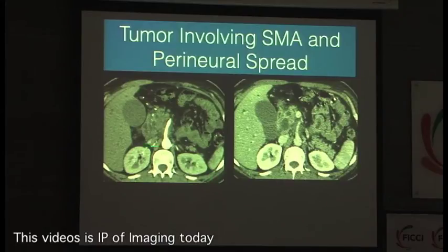So once the tissue goes along the peripancreatic neural plexus, you may not see the primary tumor extending as such to the artery, but you can see this. Can you see this ill-defined soft tissue thickening around the SMA? Again, I showed you fat last time. This is fat. Fat is black, and this is gray. So this gray stuff is all tumor, which has come from the peripancreatic neural plexus to surround the superior mesenteric artery, and this is also unresectable.